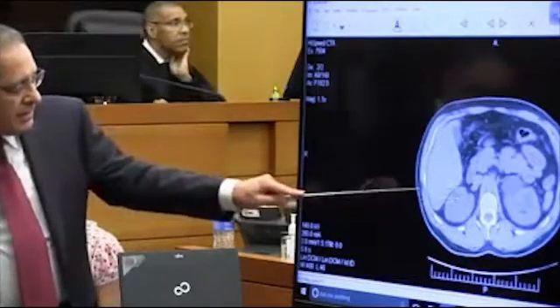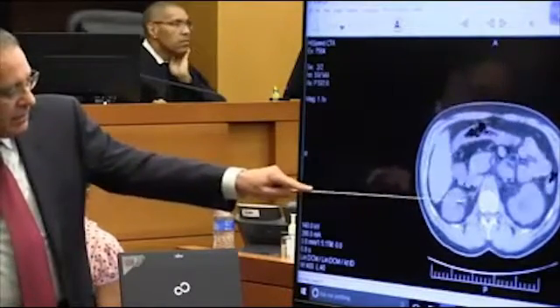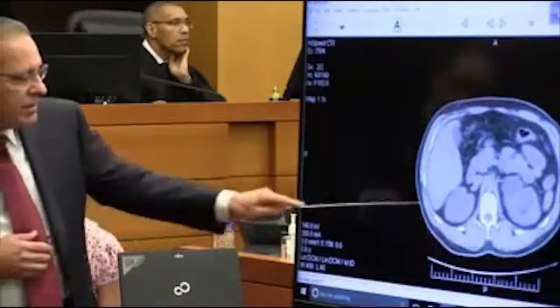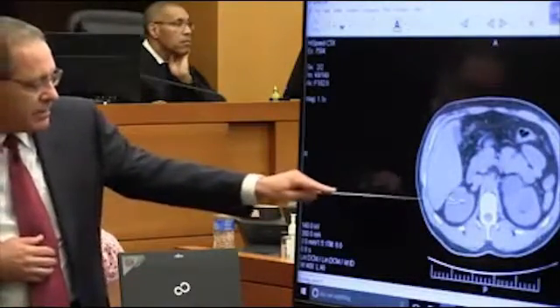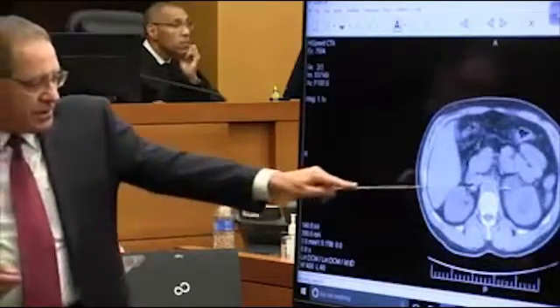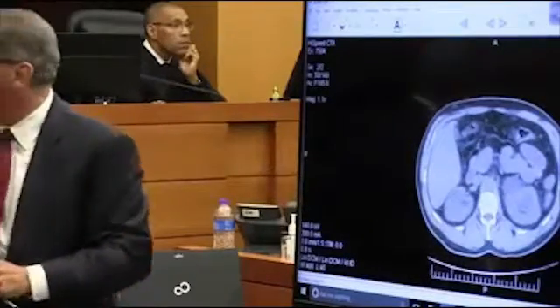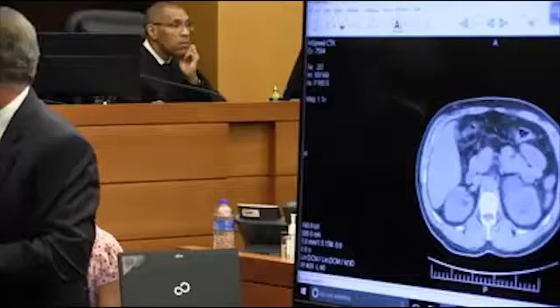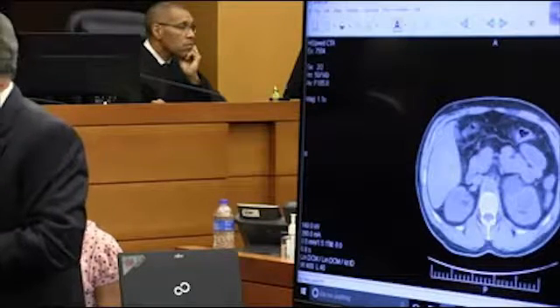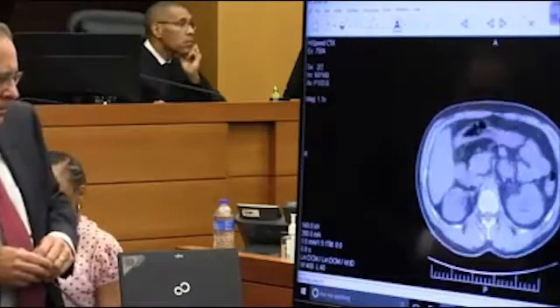If you scroll down, you'll see it starts over here, and then it's over here, and it moves tangentially this way, suggesting possibly an ovoid appearance, or maybe even a cylindrical appearance, because it starts here and ends over here, as opposed to this cyst here, which starts and stays in the same plane the entire time. Does that ovoid or cylindrical appearance mean that that cyst needs a follow-up contrast CT scan? It does not.